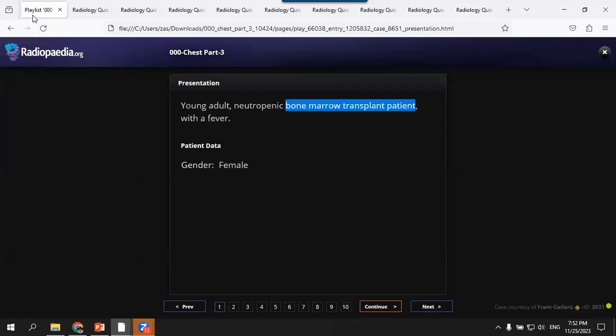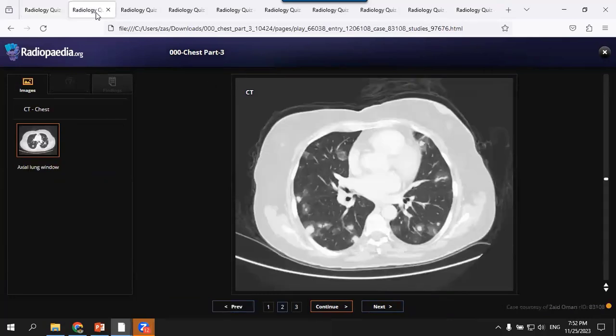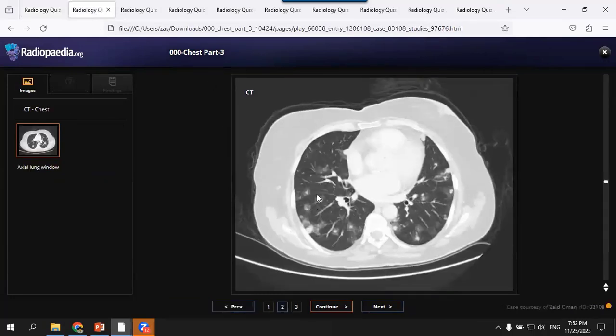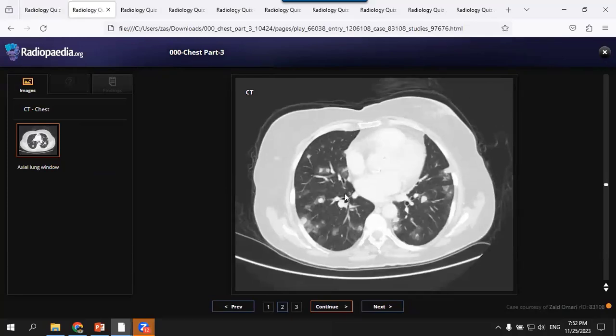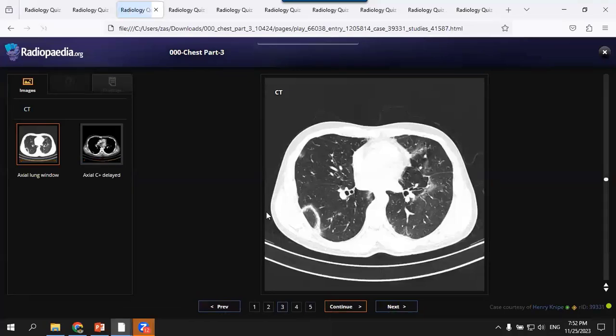Okay, so in summary, we have some differential diagnoses according to the patchy opacities. If solitary or multiple patchy opacities in an immunocompromised patient, think of aspergillosis. If multiple lung nodules or opacities with a halo, if nodules, it's hemorrhagic. If patches, it's also hemorrhagic.